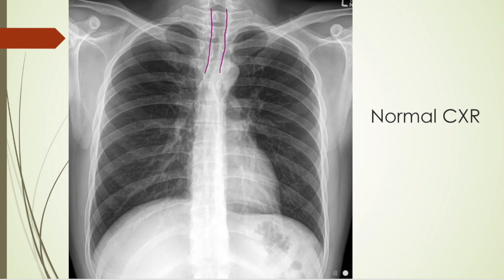I'm going to draw this out. And you can see where it bifurcates. Looks like it bifurcates right here. This is the carina. Excuse my writing. You can trace the airway down here and over here.